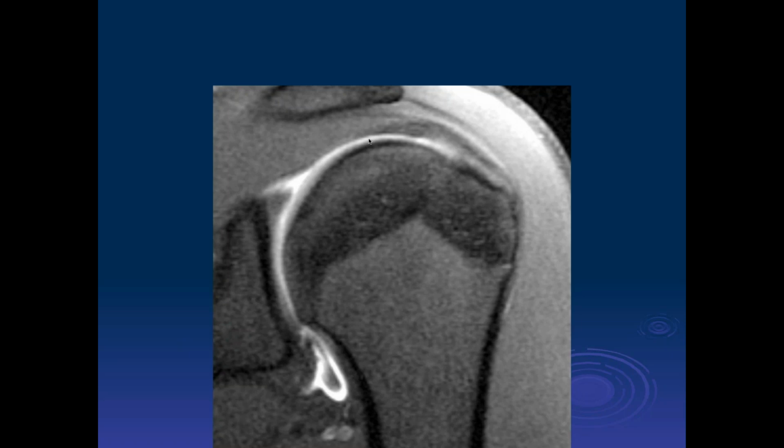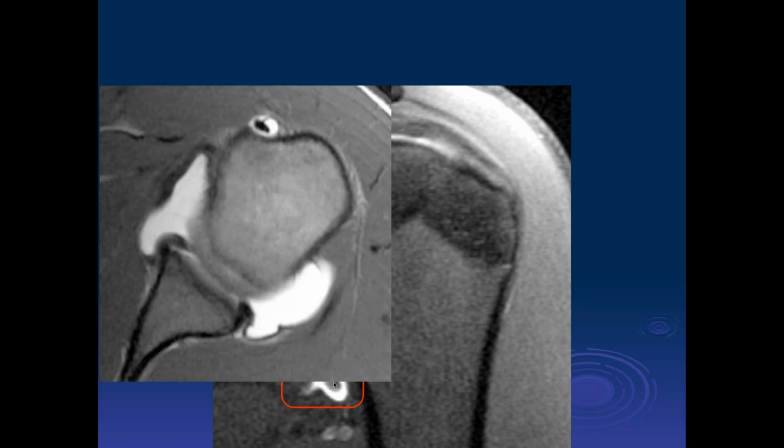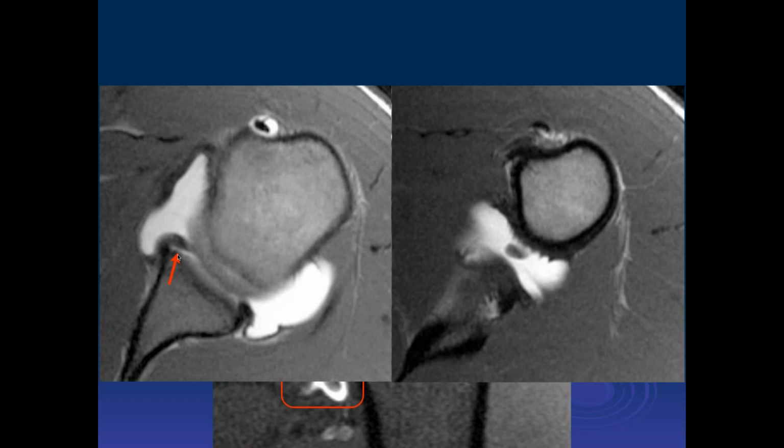Okay, there is increased signal in the inferior labrum. It looks like there's a tear, and we have some fluid in the axillary pouch. It doesn't look like a cyst. I think they just have an inferior labral tear. And what's that low signal there? So maybe you can see a tear here. What's all this stuff? Is it acute? An axial image showing signal below the equator, so you shouldn't have signal at the base of the labrum there. When we go inferiorly there, we have this.